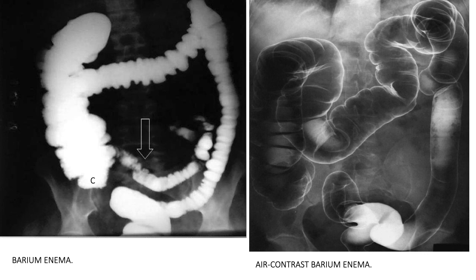So let's pass and talk about terminology. What is very important when we talk about contrast studies and fluoroscopy in specific? We have to know the terminology. You're going to see it frequently during your life as a doctor. No matter which specialty you are from, you always have to be dealing with radiologists. Okay, so just try to pay attention.